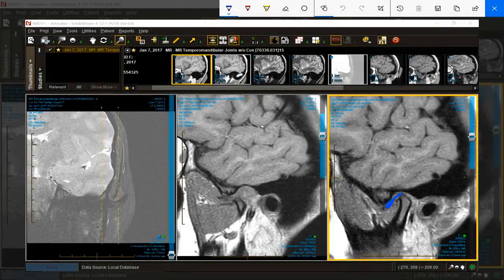Now, it's not uncommon for me to start in the open mouth view because I see the posterior attachments nicely stretched out. The anatomy is often a little clearer. But in this case, I've got them up side by side. This time, the condyle is sitting in the condylar fossa. This time, there is not sclerosis of the articular eminence. And the meniscus should be right here.